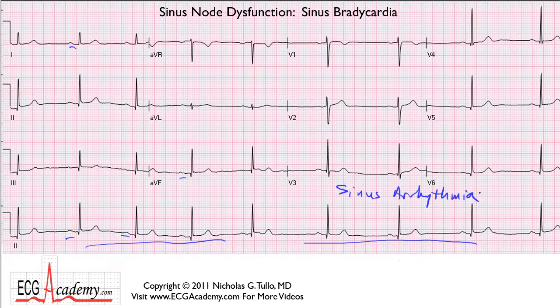But it's pretty remarkable how you have a heart rate here of 300, 150, 100, 75, 60, just under 60, maybe 58 beats per minute, but then over here it slows down dramatically to a rate that's actually below 50 beats per minute. It's about 46 beats per minute.